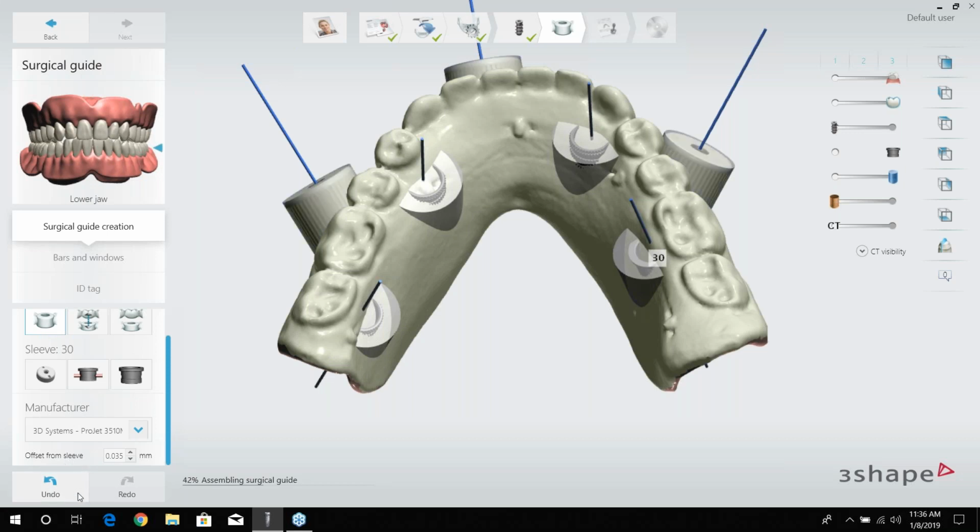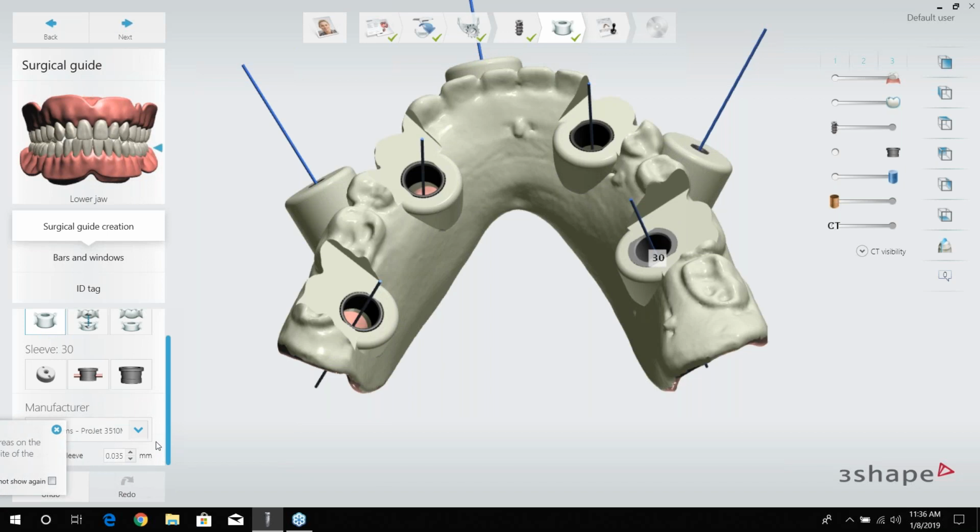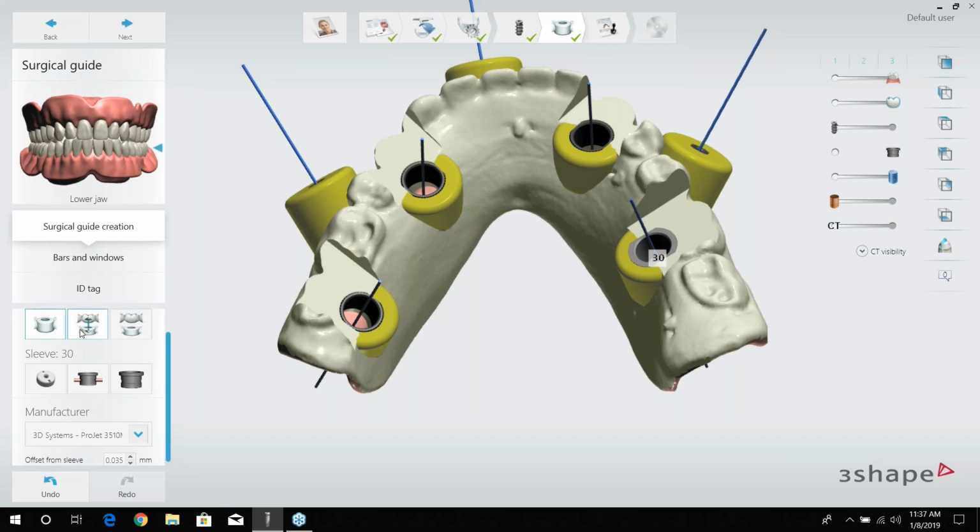And there are 3 other values that you don't see here because they're not really important to Edentulous guides. Really the only thing that's important to the fit of an Edentulous guide is the sleeve offset. But for tooth-borne guides, which you can see if you go and watch the previous webinar, you have the offset from the teeth, which is going to determine how it fits and seats. There's also an undercut retention value that you can adjust, and a thickness value. The reason you're not seeing the thickness value on this is because it's using that denture CT as the guide, so it's going to be plenty thick.